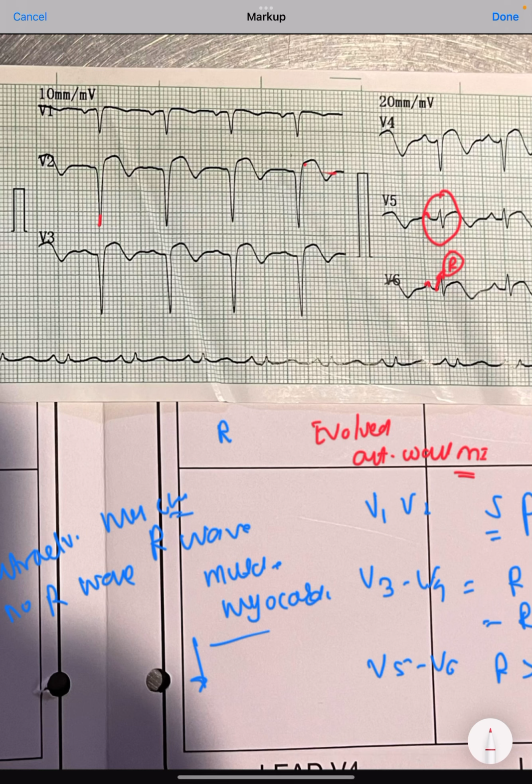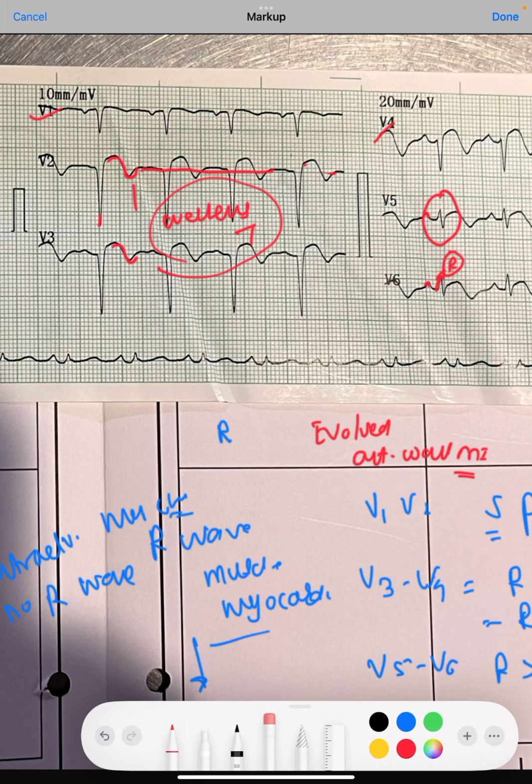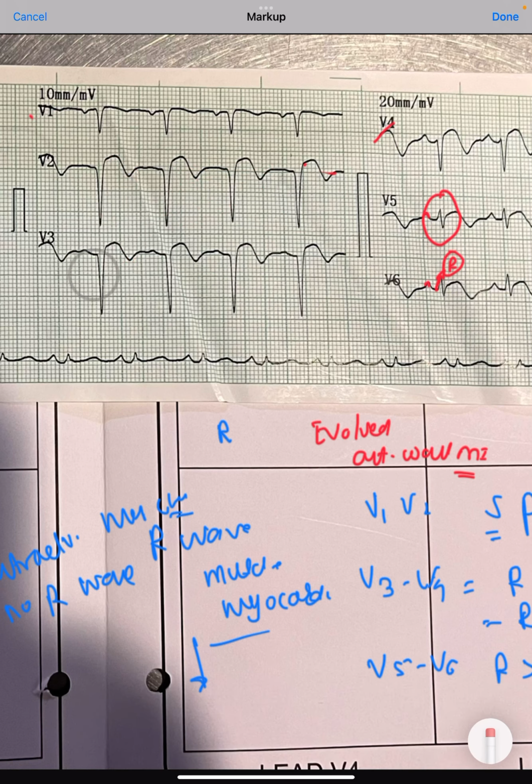So Q wave is present only in V1 to V4 with prominent ST elevation and a marked ST or biphasic type of T, which is very typically seen with Wellens T. To call it Wellens T, the patient should not have ST elevation or ST depression, and should have normal R wave progression.